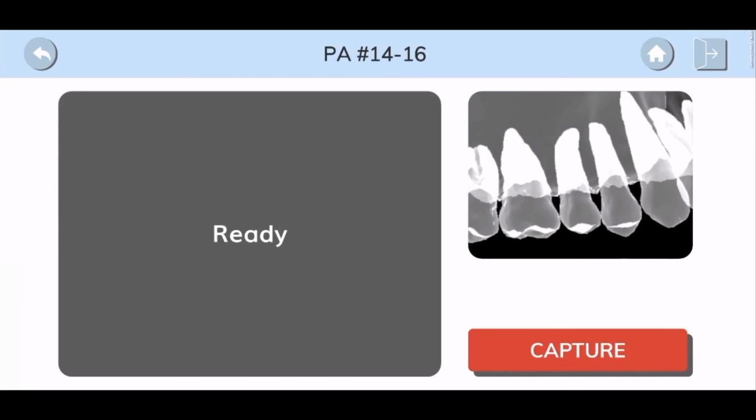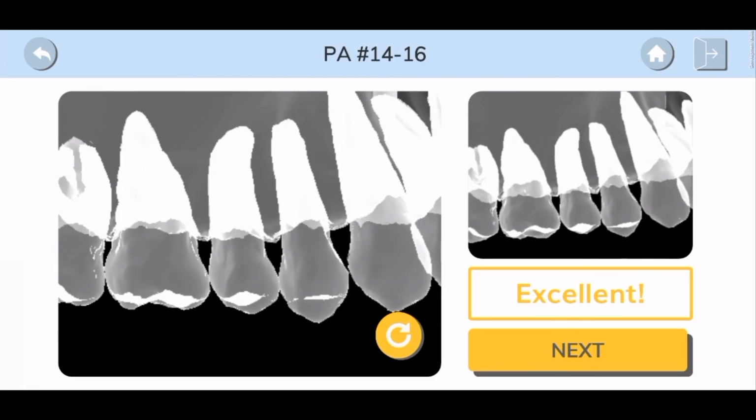Make sure that both of you have a chance to attempt the same position before moving on to the next one in the list. You may move on to the next position by clicking Next.